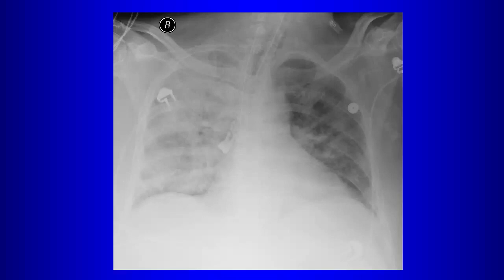It's atelectasis. So you think it's atelectasis. Is there enough volume loss to say it's atelectasis? No, but there's something in the right mainstem bronchus. Yeah, so there's a consolidation there. So what is that in the right mainstem bronchus? It's like a tooth. That's a tooth, right? So you can explain all of that. This is a post-obstructive change, or pneumonia, from this tooth in the right mainstem bronchus, right?